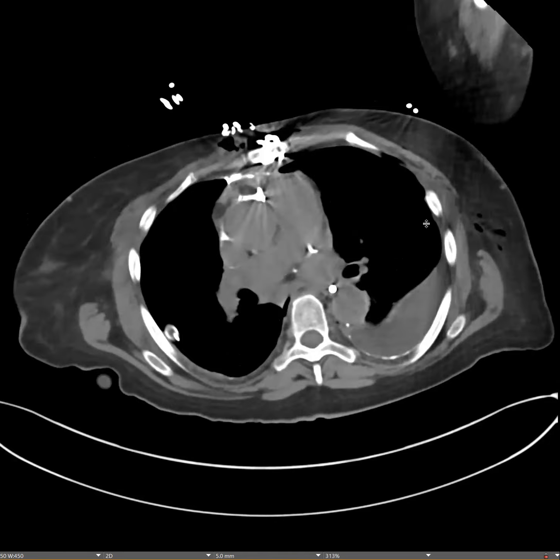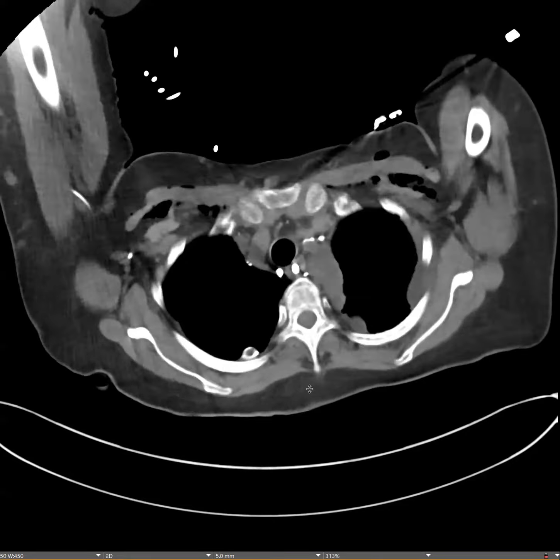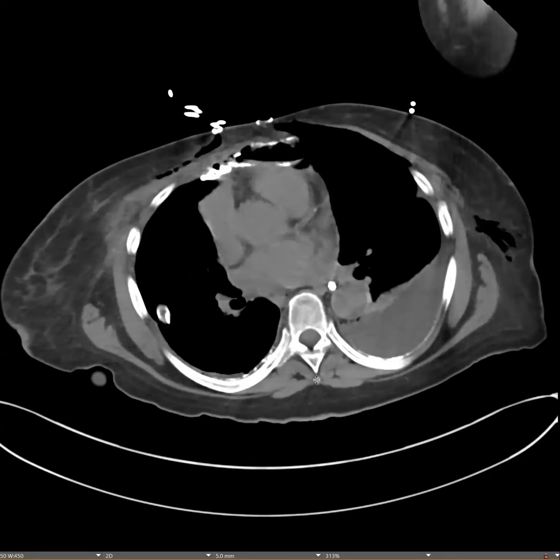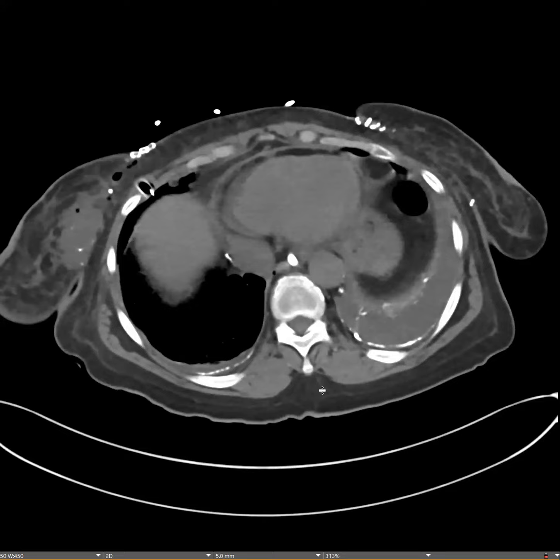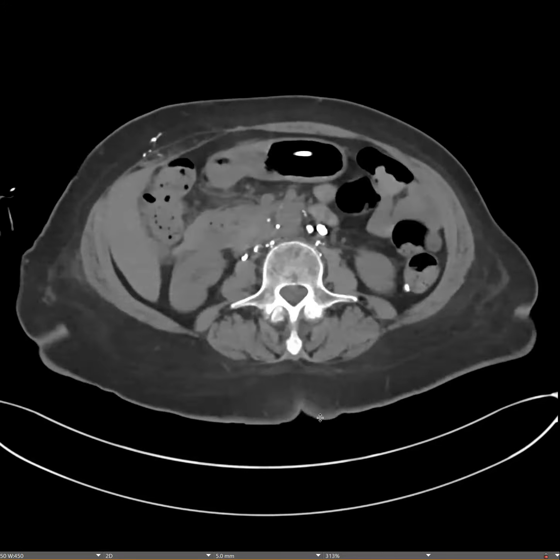The patient had abdominal pain and a history of heart failure, long-standing sarcoidosis, and acute on chronic respiratory failure. The previous day, the patient had a thoracentesis and then another procedure, and then they wanted to check a post-procedure CT.